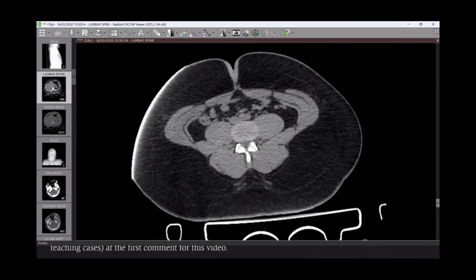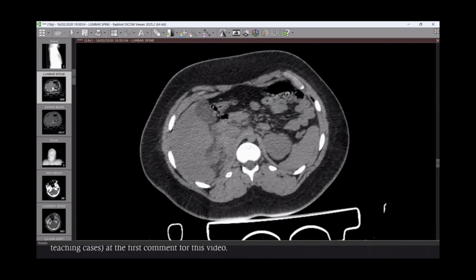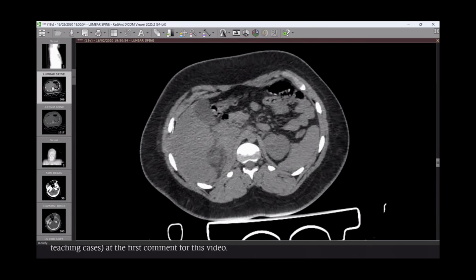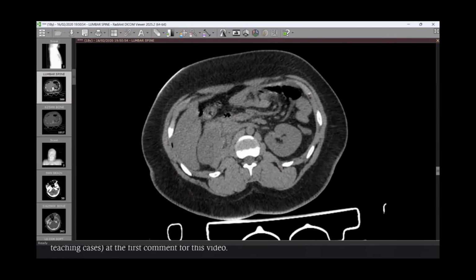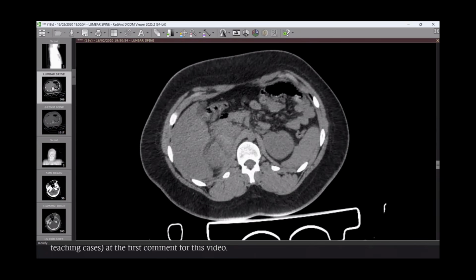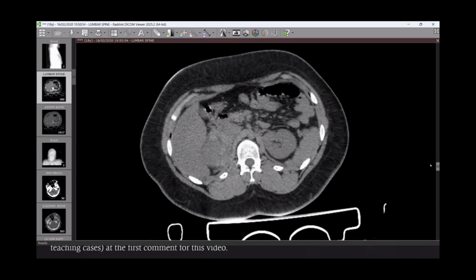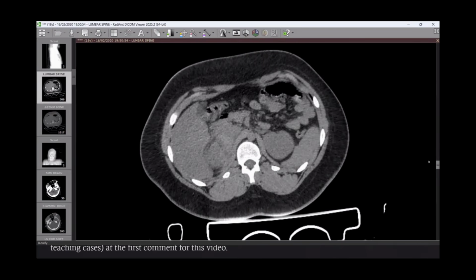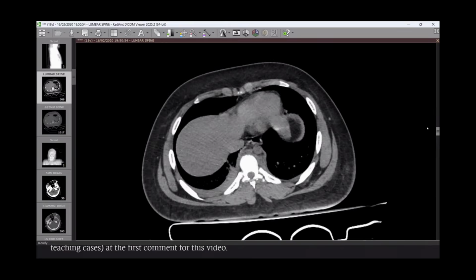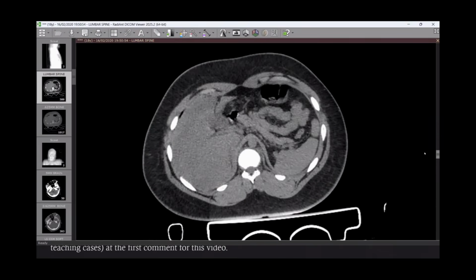No free fluid I could appreciate in the abdomen, but in the right hepatorenal pouch there is evidence of abnormal hyperdensity, which may be at the level of the right adrenal gland. So it could be adrenal hematoma. I'm trying to look if there is any other abnormality in the liver or kidney. I couldn't really appreciate lacerations in the liver.